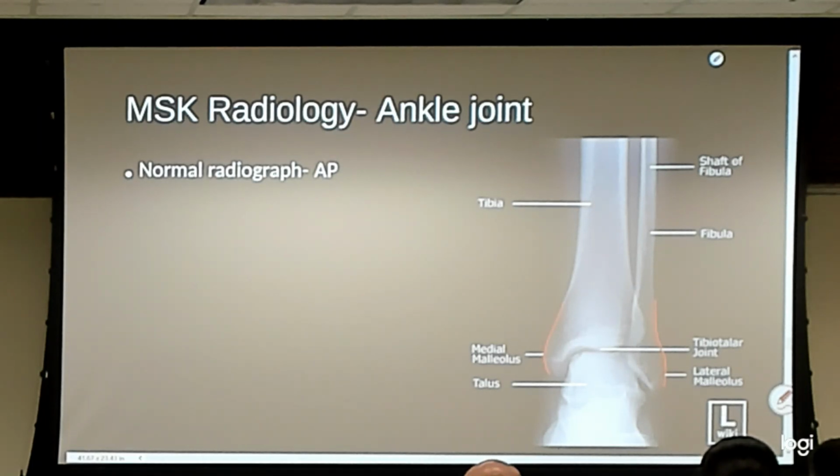Okay, deltoid ligaments. So we can't actually see them. We infer their location. They're going to go from the medial to this bony prominence here. Deltoid ligaments. We can't, again, see the ligaments out laterally, so we're going to infer. ATFL. If you want to put on the others, that's cool. It doesn't matter. They're there as well. Just do it properly overlap.